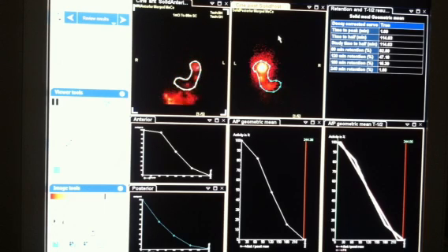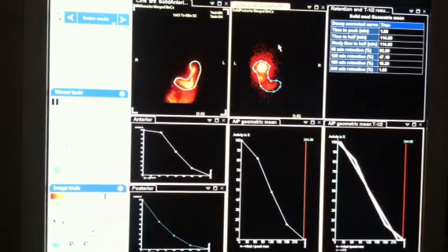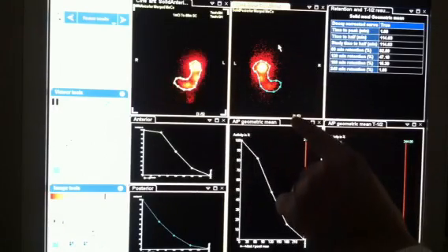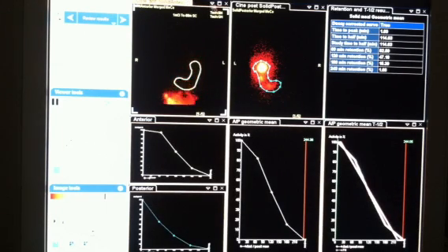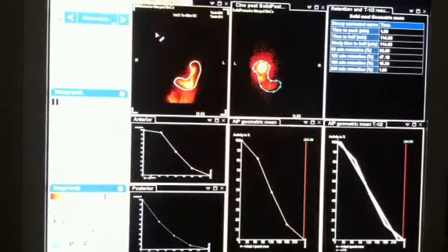Now you can still scroll using your mouse wheel, and when you do, bring it all the way till it's full. I like to get that first image, the number 1 image, on this one. Because when you save this splash page in the cine mode, it'll only save this one square here, that one frame. It won't do all of them, so this is the only one we can see as a cine. So this one I stop, and then I put it onto the first frame, 1 of 5. Now I've got this one here. It's still ticked on, right? And you want to make sure that you come back here and click this till this is orange and these are ticked on. That's going to save this cine here.